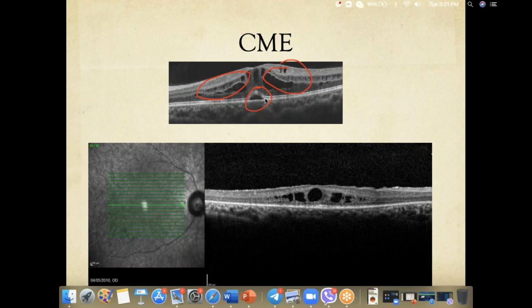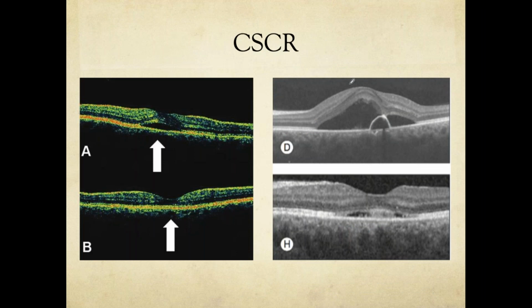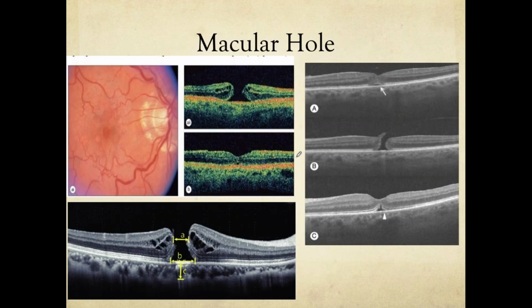So can you revise again? Is this a CSCR? What do you think? Asta Suwedi has said it's a CSCR, maybe. Manoj Mahat, CSCR. Prativa has said central serous retinopathy. After I compare this image with this image, do you think the previous image is still CSCR?